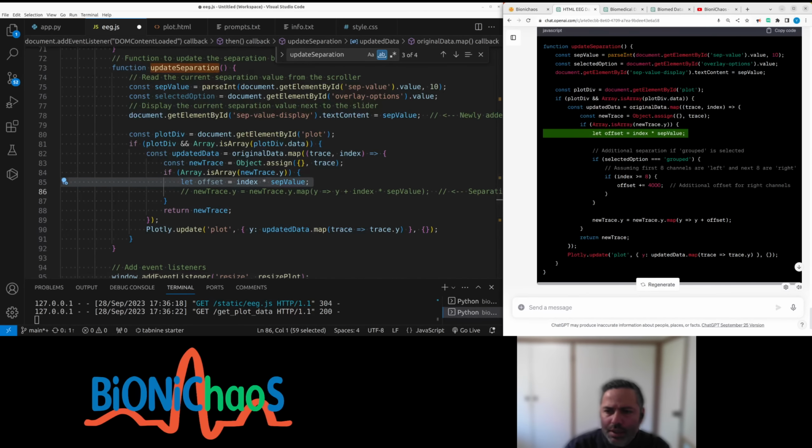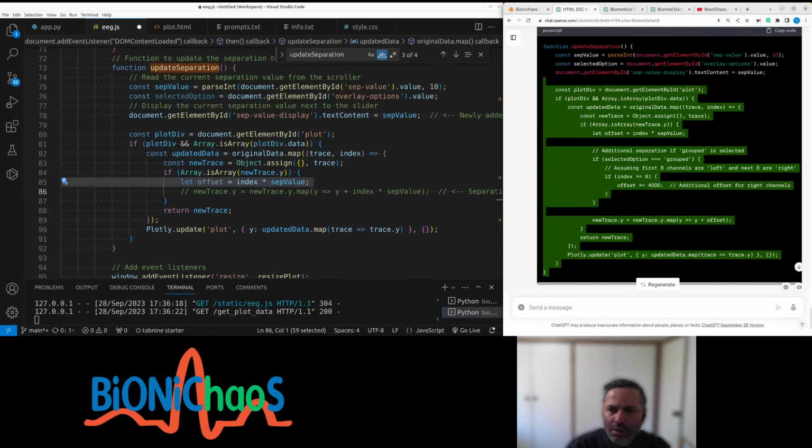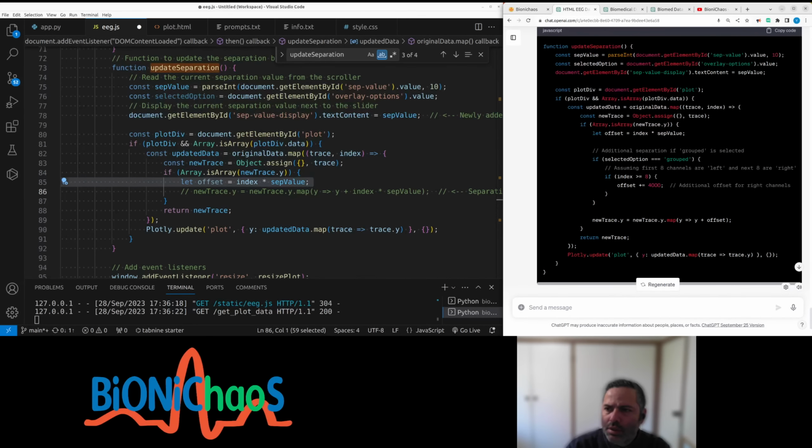Where were we? Index. Okay, how about update separation? Just replace.